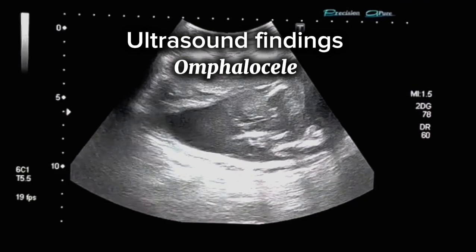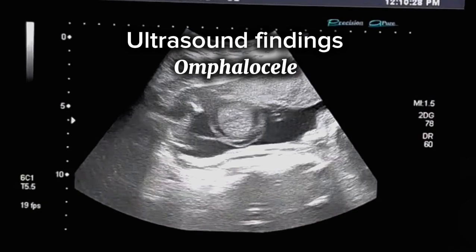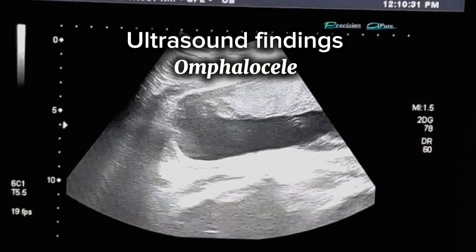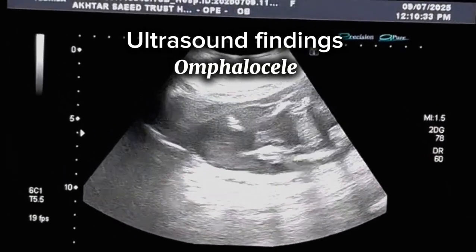Recommended further workup is amniocentesis for karyotyping and chromosomal microarray analysis. TORCH screening if clinically indicated. Fetal echocardiography to rule out associated cardiac anomalies.